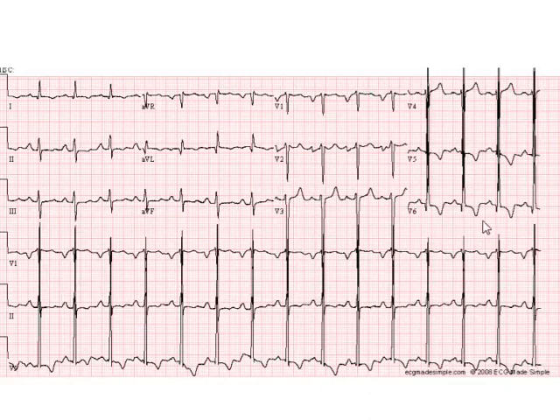This patient had previous coronary angiography demonstrating normal coronary arteries, suggesting that the inverted T waves are likely a variation of the strain pattern that can be seen with left ventricular hypertrophy.